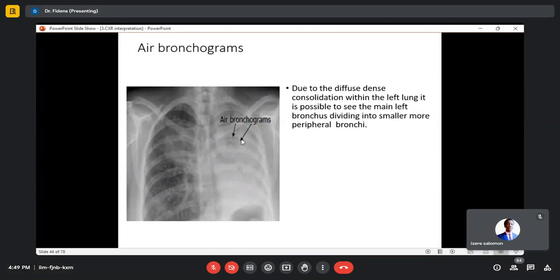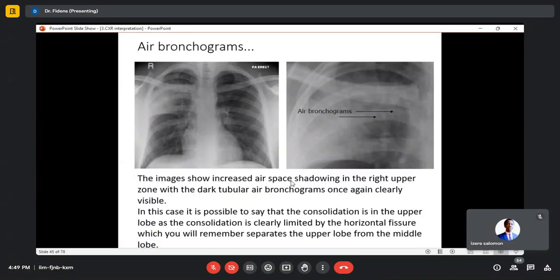I just wanted to talk about the air bronchogram sign, but they ignored these other signs. I think this can be anything. This can be cancer, mediastinal lymphadenopathy, a lung tumor, if metastasis, it can be anything. But the reason for this is for air bronchograms.